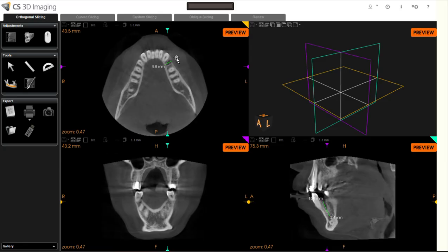Now, this is the system or the application that all of us use for CBCT scanning visualization. It's called CareStream. It comes with any CBCT that you take. It comes with it. So you can download it and it appears. Here we have an implant case, bony defect.